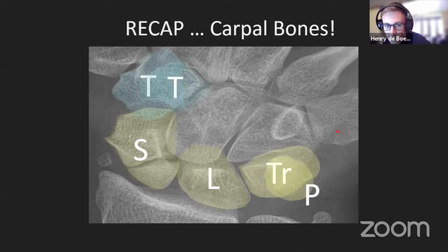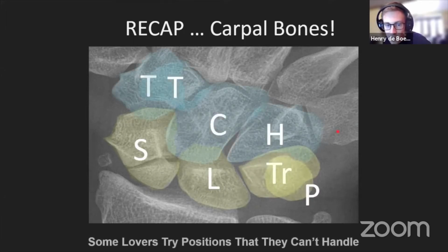There we go. And the mnemonic that I was taught at medical school, and some of you may know, there are other mnemonics available, is some lovers try positions that they can't handle.